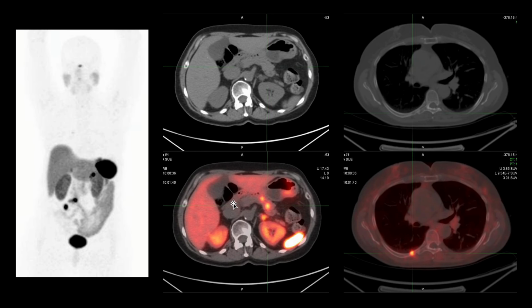One of them is a focus in the bone, and it may or may not have any anatomic correlate on the CT in the bone windows, but when there is focal uptake like this, this is consistent with bone metastasis. Remember, there is physiologic uptake in the adrenals, so this is the left adrenal showing physiologic uptake, and in the pancreas there are two additional previously unknown foci of increased uptake. So these are additional neuroendocrine tumors and additional primaries visualized in the pancreas.